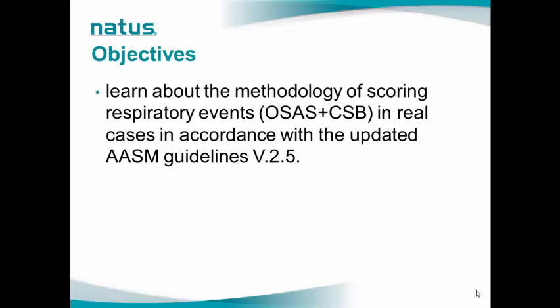In this video, we are going to learn about the methodology of scoring respiratory events in two cases, in an obstructive sleep apnea syndrome patient and in a Cheyne-Stokes breathing patient, in accordance with the updated AASM guidelines version 2.5.